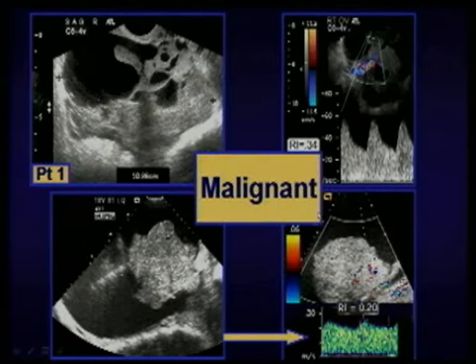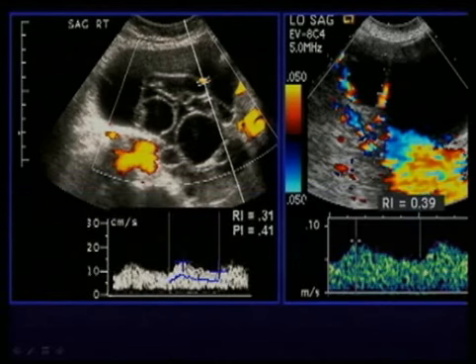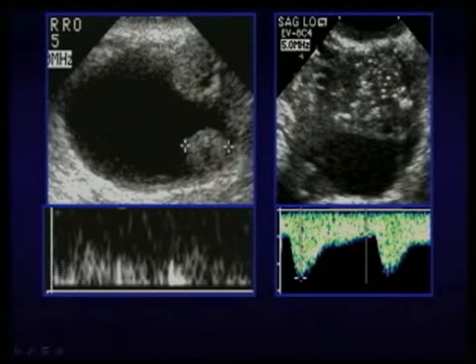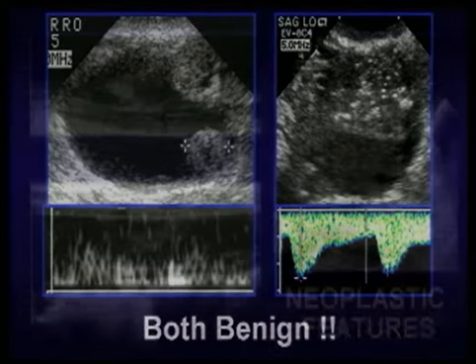They have flow. They really shouldn't cause you confusion because they look so different from the 6 lesions I've shown you. Flow and septations can't be ignored, although they will not always be due to malignancy. Fortunately for this woman, this was a benign lesion that was septated, and sometimes you can see that with an endometrioma, but they must come out. And finally, occasionally you can have masses that look ominous, and the pathology tells you that they are not cancer, they are benign, often benign neoplasms.